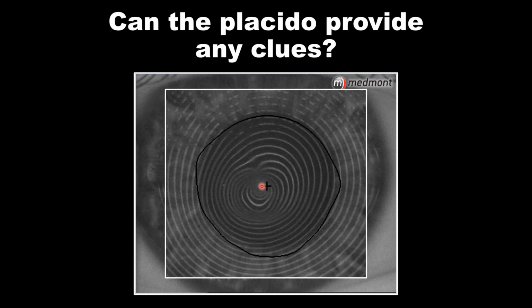But if you have a highly scarred cornea, a consideration might be to put on a really low modulus soft lens, something low in power, and I would usually use a plus lens. I'd rather think the cornea is slightly steeper and fit my contact lens steeper than the possible real shape rather than flatter. I'd rather risk apical clearance than risk touch. So try doing topography over the soft lens when you run into some scarring like this.